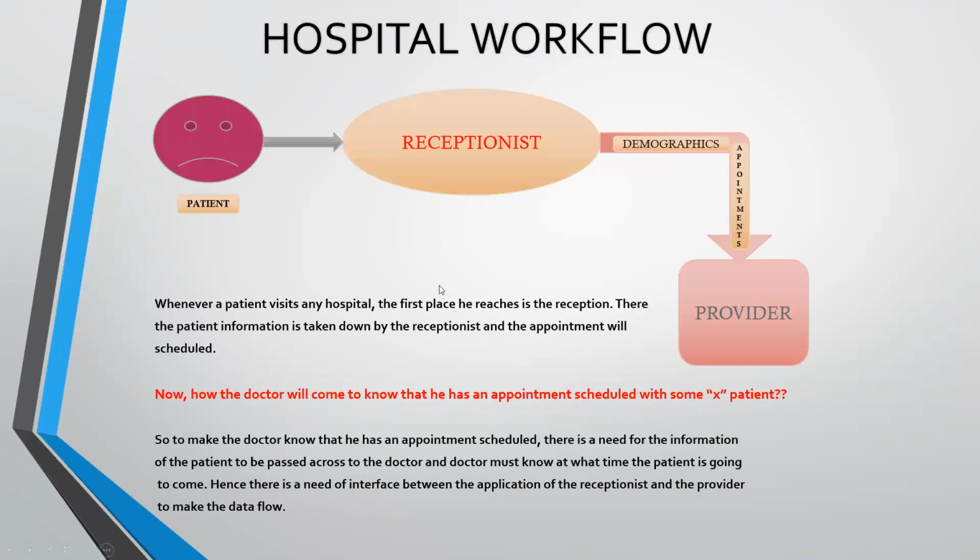So let us quickly go through the hospital workflow. This is the basic place where we should start. Hospital workflow is something that acts as a blueprint for the entire HL7 messaging standard. During our course, we'll be referring back to the hospital workflow a lot of times so that we understand how exactly an HL7 message operation takes place. This is where it all starts, so that's where we will also start.